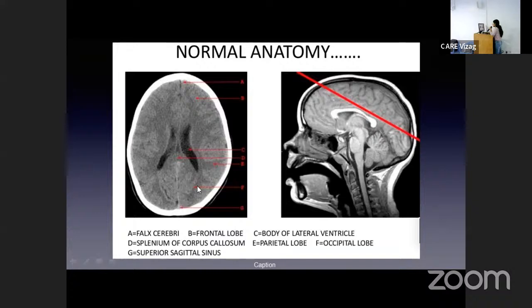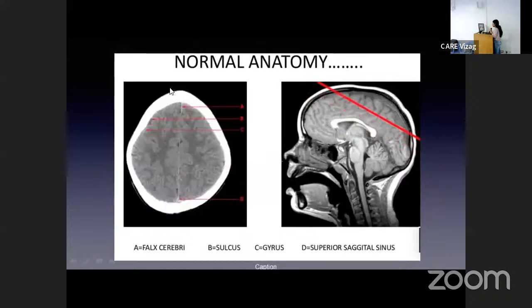And these are the occipital lobe and the frontal lobe. And laterally, what you're getting is a parietal lobe. And this is well above, it's at the level of the centrum semiovale.